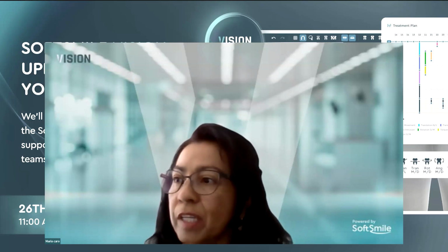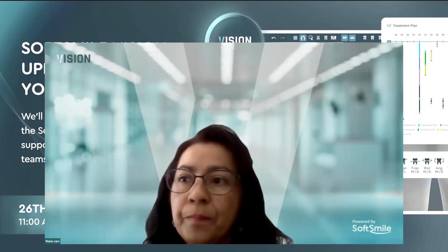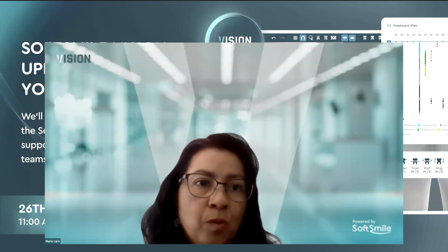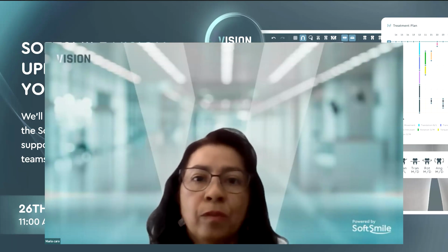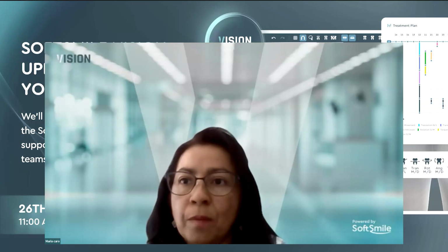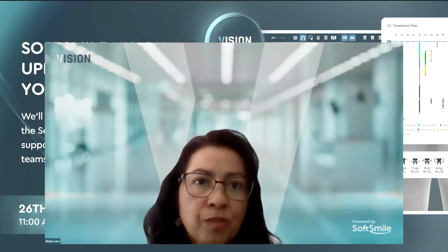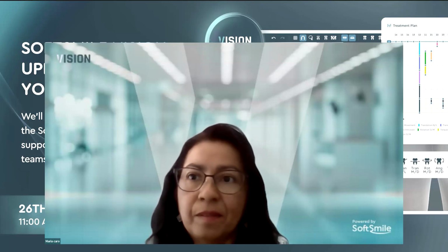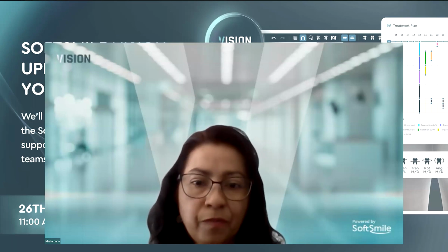So today, we're going to be covering some of the updates that were recently released, and what we're going to be talking about is version 1.13.3. We're going to go over where you can access those options. I'm just getting my windows ready, so pardon me if I look like I'm looking all over the place, but I'm trying to get that particular window ready for you.